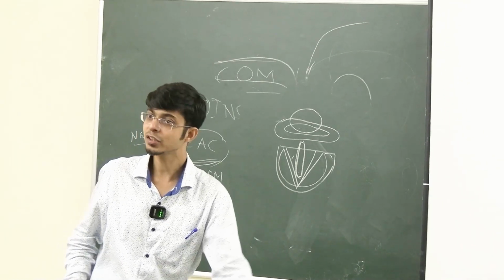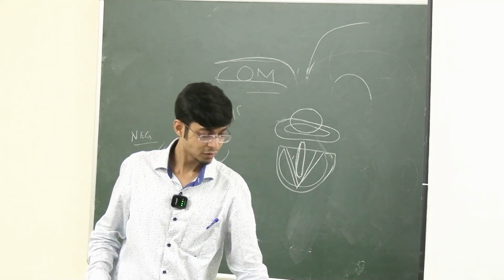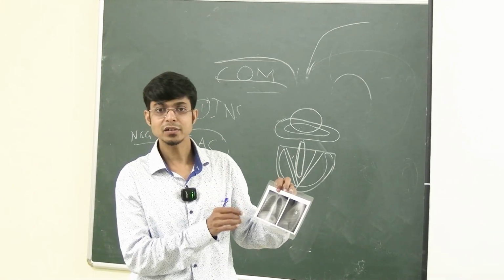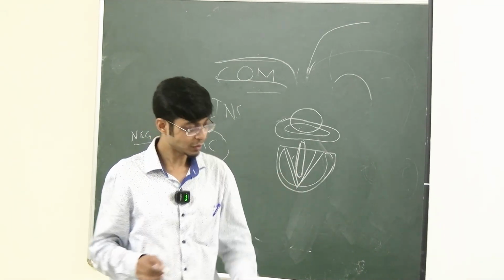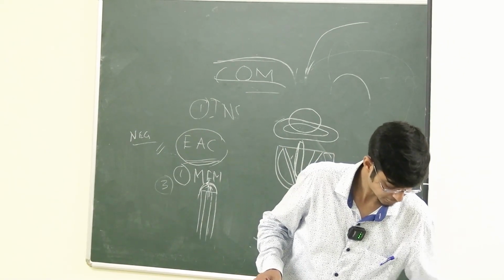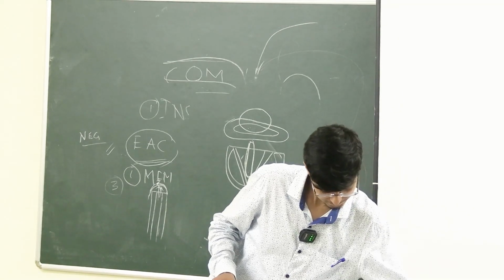Okay, so clear about this one? Any questions? So how will you say? So we'll say that it's a skiagram of the thorax or the chest showing a foreign body in the trachea. আর একটা এক্স-রে আমি দেখাচ্ছি, এটা দূর থেকেই দেখ, should be fine. Another good X-ray.